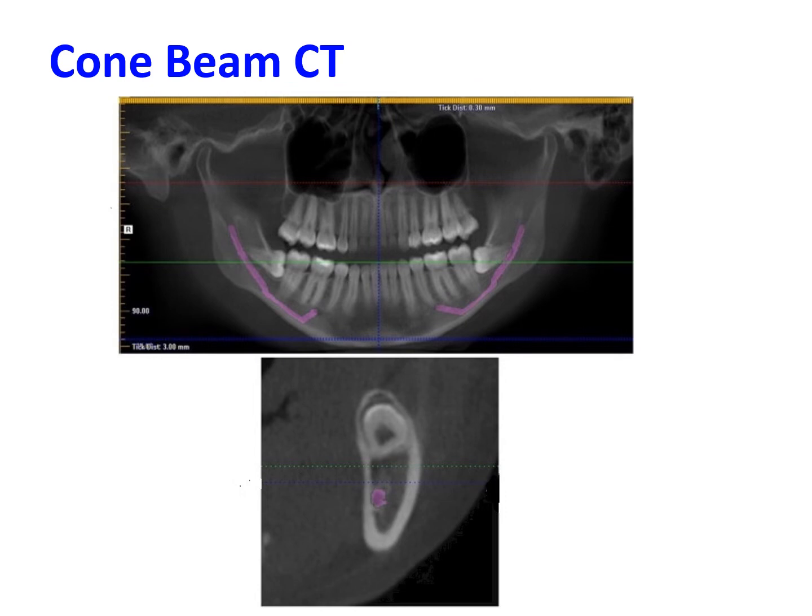If you encounter wisdom teeth which show a close relationship of the root apices of the third molar with the inferior alveolar nerve canal as observed on the OPG, such as overlap of the inferior alveolar canal shadow by the root apices, sudden deviation of the canal, darkening of the roots, or dilaceration of the roots of the third molar, then that might be an indication to carry out a cone beam CT scan prior to finalizing your treatment plan.